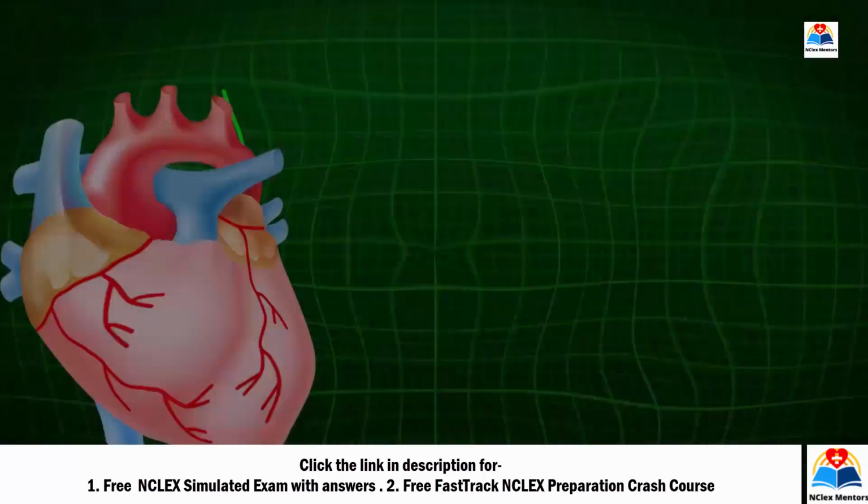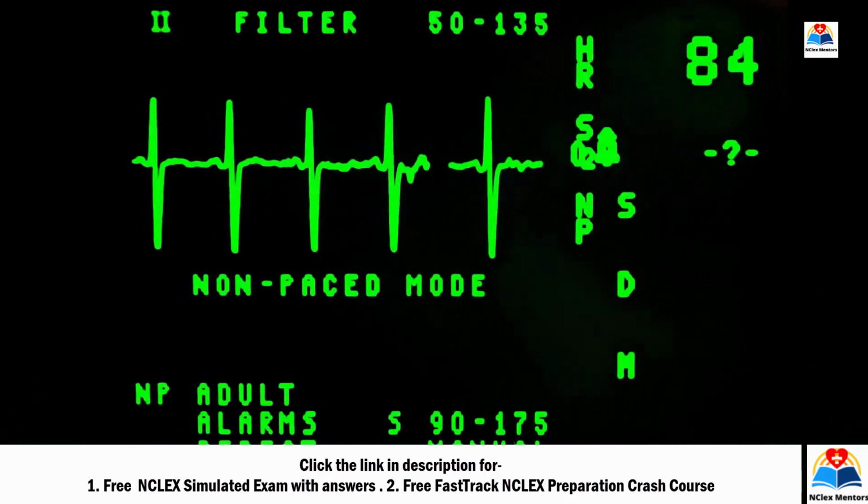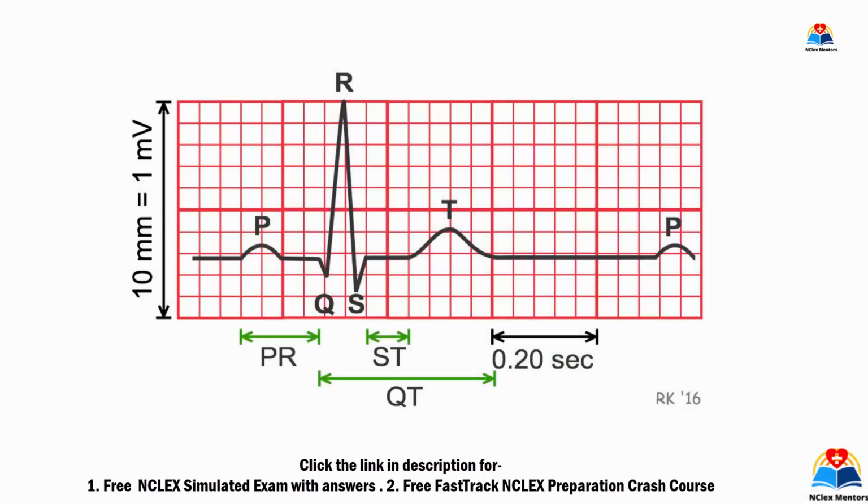We will refresh our knowledge in brief about cardiac conduction so that you know the origins of the wave you see in the ECG and the components of the heart wave. This figure that you see here is a normal heart wave. You see different marked peaks and depressions and gaps in between these things. Based on their occurrence, position, and gaps, we will interpret all the major cardiac conditions with simulated examples. So, that's for the first topic.